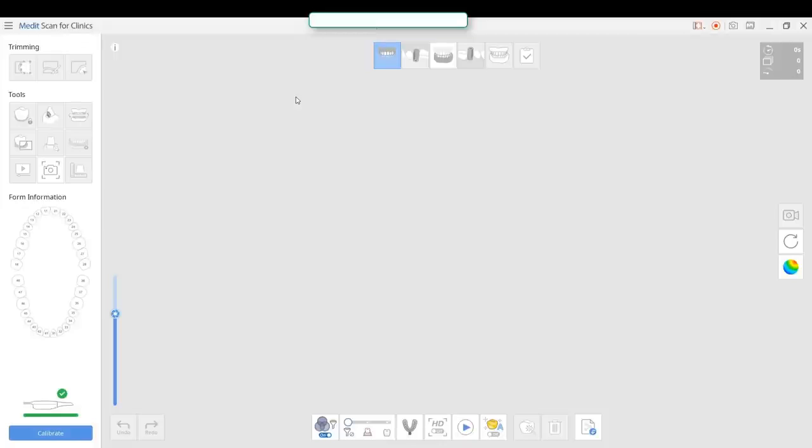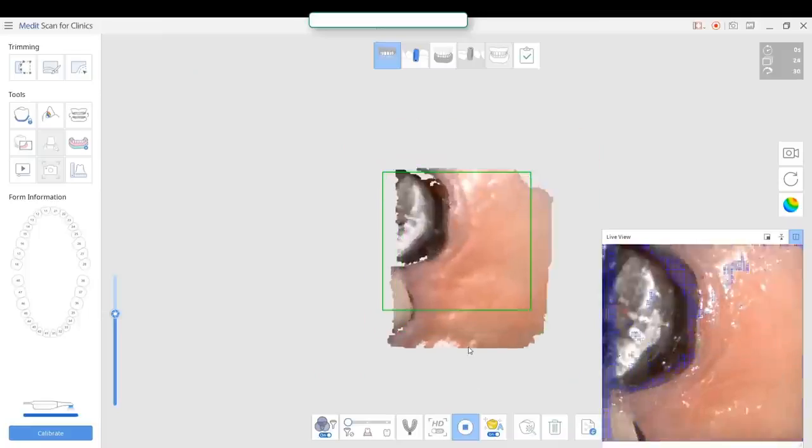Here we're featuring the software version 2.3 for Medit that has some cool new features. One of the features is to use a filter that will block out any colors you don't want in the equation. And you have a feature for highly reflective surfaces like metal that I just turned on.